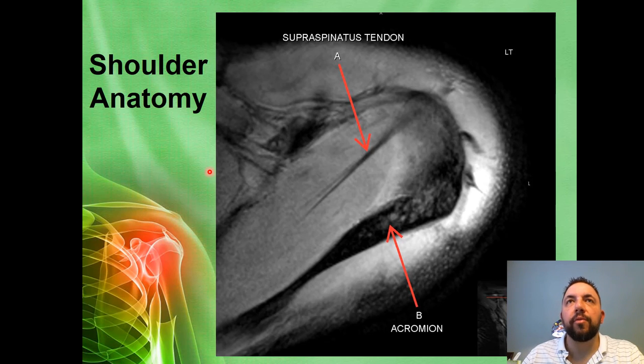We want to begin with the axial or the transverse plane because often that's what tells us, the technologist, the appropriate scan plane that's utilized for our coronal or sagittal, very often oblique in nature. So we want to begin the bulk of our orthopedic MR examinations with an axial plane. So here, if you look at the little scan plane, we're a little superior in the shoulder joint, and the first thing we cut through is the supraspinatus tendon, pretty high in our application.